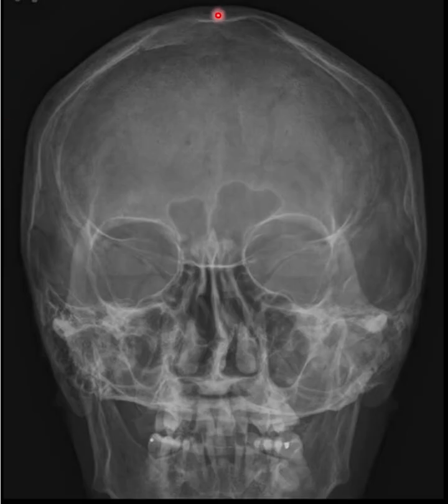So we're going to look for the vertex up at the top, and then follow the border of the skull around to the parietal eminence to make sure that we did not clip the lateral borders of the skull, and continue to follow that down to the mastoid tips, the right and left mastoid tips, and we can follow the mastoid tip around that base of the skull here, and then to the other mastoid tip, and then up around this lateral part, parietal eminence, all the way back up to vertex. So this tells me that we have not clipped any of the skull.